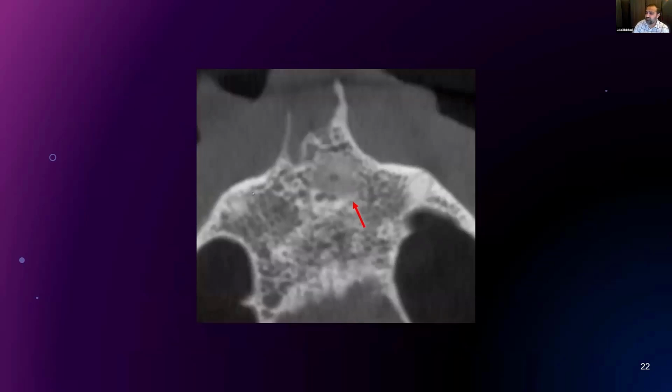This is a cropped axial section of the maxillary arch. The arrow is pointing towards the area of interest, which is an oval-shaped entity with granular characteristics. Dr. Baglini will go into detail on the internal contents, but when comparing it to the adjacent bone, it seems kind of granular. And the peripheries of this entity tend to blend in. Not only that, there's no cortical border, no radiopaque or high-density border that surrounds this. So this is an example of a non-corticated pathology.